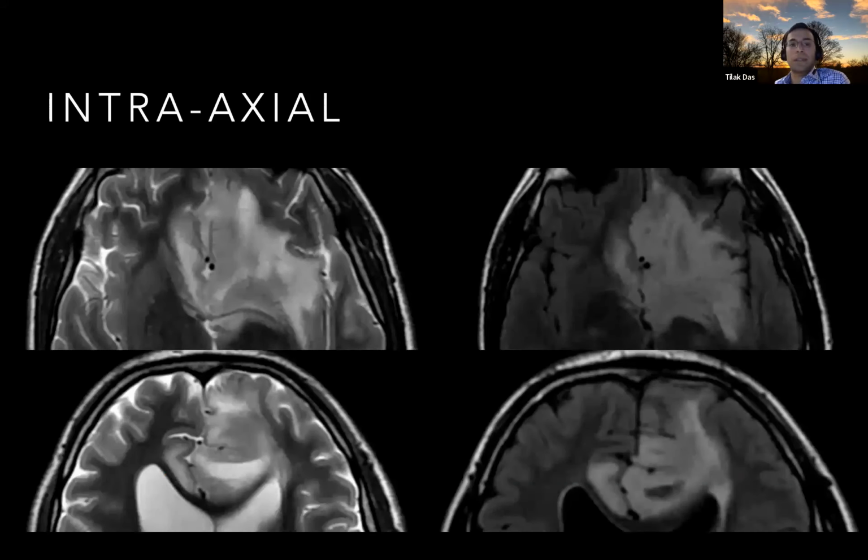And of course, intraaxial lesion, in this case, a diffuse glioma. We saw a few of these a couple of weeks ago, and it's much more obvious that it's within the brain parenchyma. It's not even near the surface there, but medially it herniates under the falx, and there's a poorly defined border with the rest of the brain parenchyma, and no buckling of the cortex, unlike what we saw before.